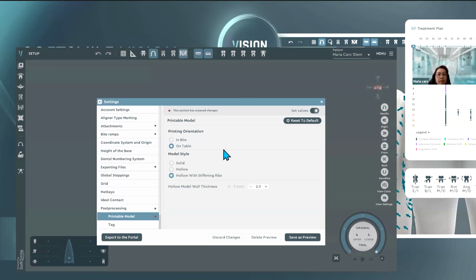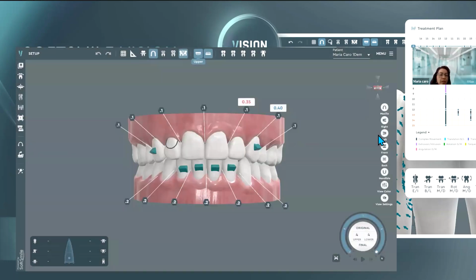So once you set it and you export, those will become available based on these settings. Okay, so next we're going to go over an additional step that was added. And let me make sure I have that window open. So the next option that we added to this version is what we call a quality checkpoint. And this has been added to the portal.